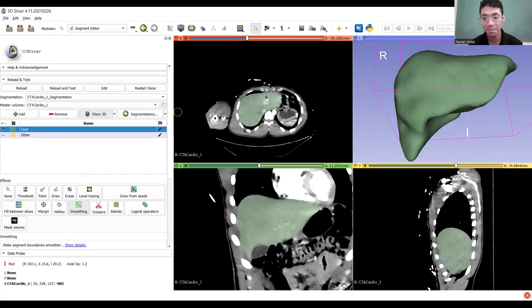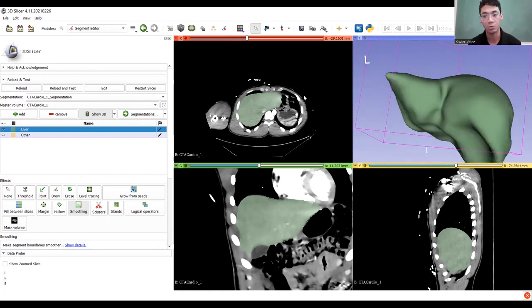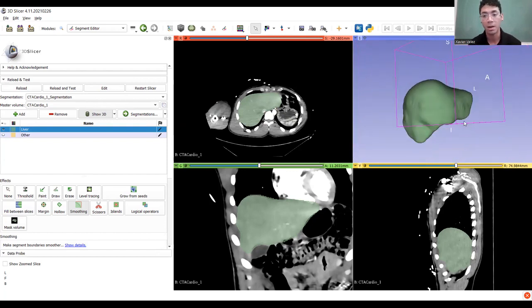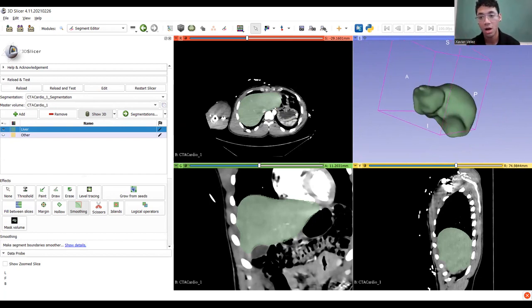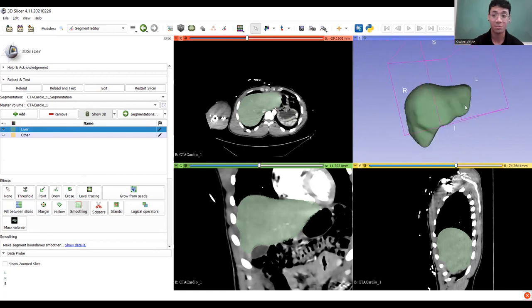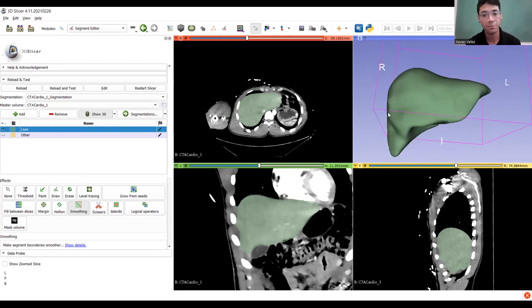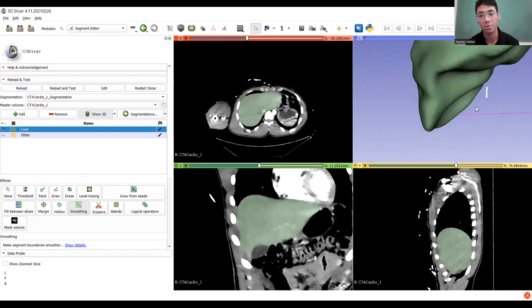So from this step, pretty much you're just going to be going in and identifying the places that you don't like and filling them in slice by slice. So again, this is probably the step that can take the longest if you want it to. Or I've got to be honest, recently I've just been skipping it because I will manually post-process these models. So if they're a little rough, I'll just sand that out because it's what I'm going to have to do anyway. But for this, I'll at least demonstrate something that we might want to do, but won't spend too much time on it.